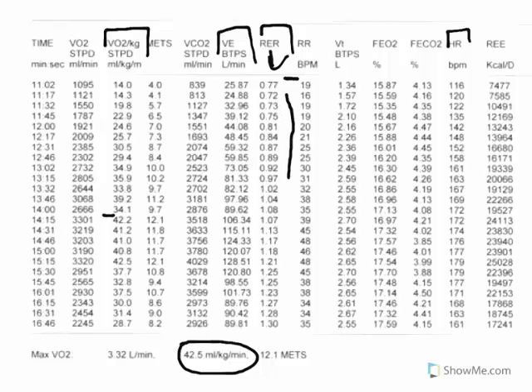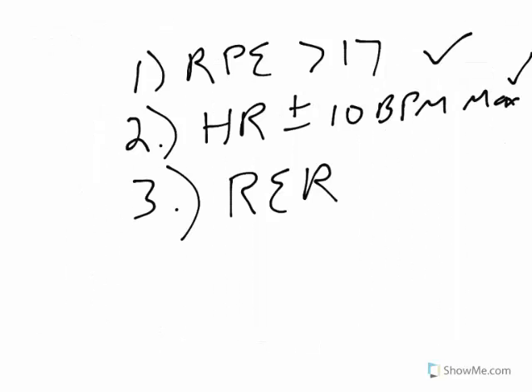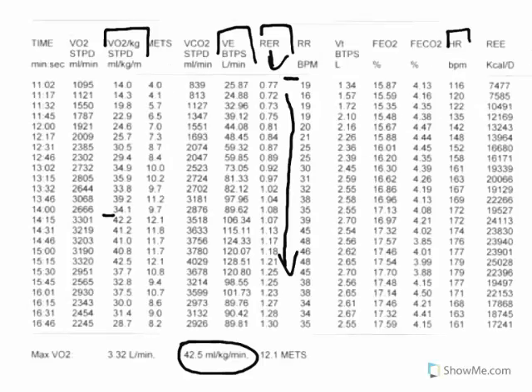This respiratory exchange ratio increases dramatically until you get above 1.0. 1.0 means that you're burning 100% carbohydrate. So then the question is, well, how the heck is he burning more than 100% carbohydrate? Well, when we look at this as a criteria method, an RER above 1.1 is signifying that he's working very hard. We see he got way well above that.